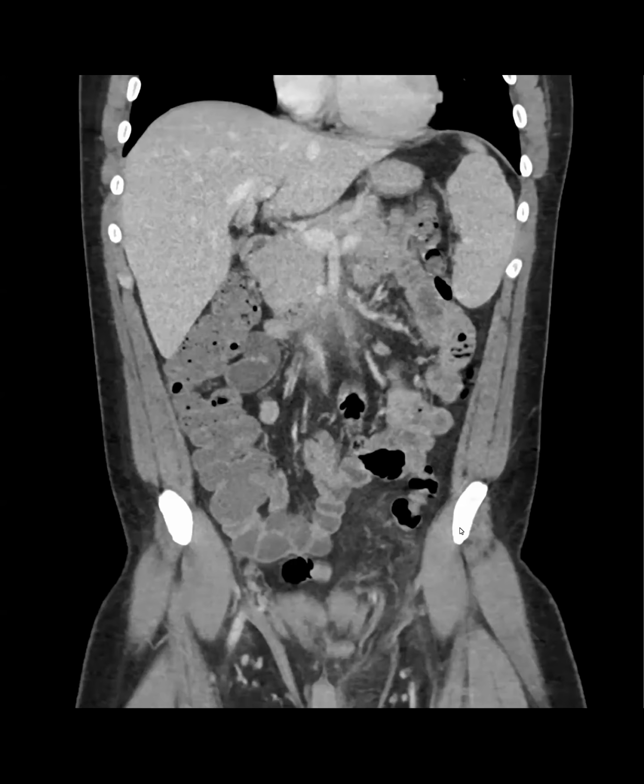Is it in the wall of the rectum? Yeah, right there. So the serosa is right here, and then you lose it. And then when you go down, it actually dissects, I think, a little bit along the left. Here's the sagittal. So here you lose the normal rectal wall signal, the serosa. And so yes, this is dissected into the anterior wall.